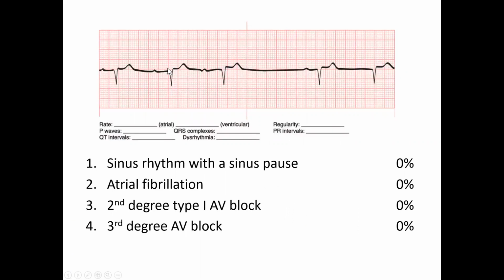If we look at this particular rhythm, again, you've got P waves by themselves, so we know that we're looking at some kind of a block. Based upon everything we've talked about already, you can establish that there's not a normal pair. So I would go with third degree. Now this one's talking second degree type. Let's look at that. So 1, 2.